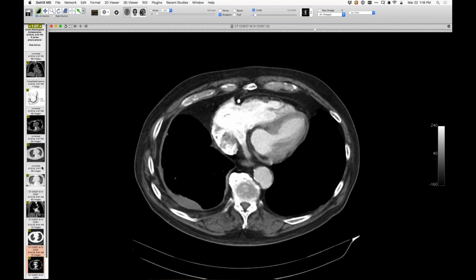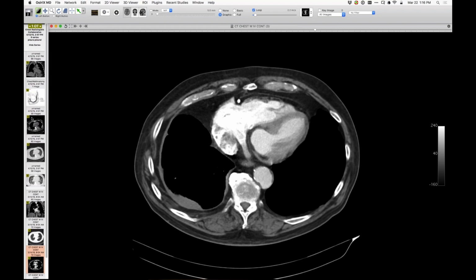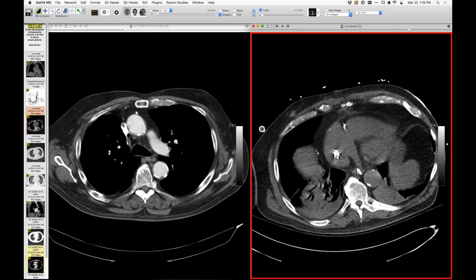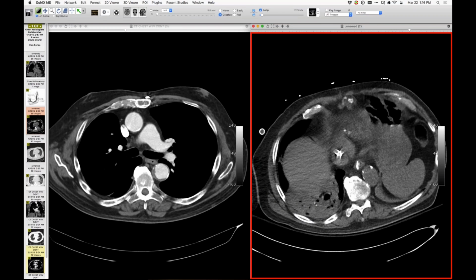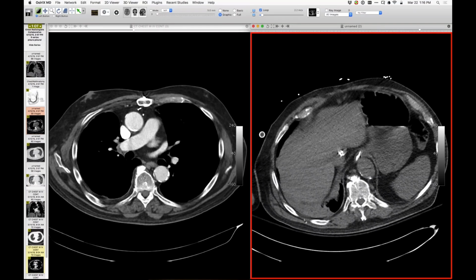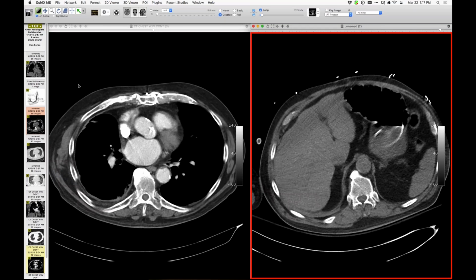It's very impressive, isn't it? And I thought I had a comparison, and I do have a comparison. So here is a non-contrast CT, sorry. And if you go back here, there was some pleural fluid there, but that extent of pleural thickening wasn't present then. I don't know what that process is in the lung and the pleura, but that pleural thickening has evolved and the fat has really become pretty prominent, or yeah, excessive. So just a nice example of that, I thought.